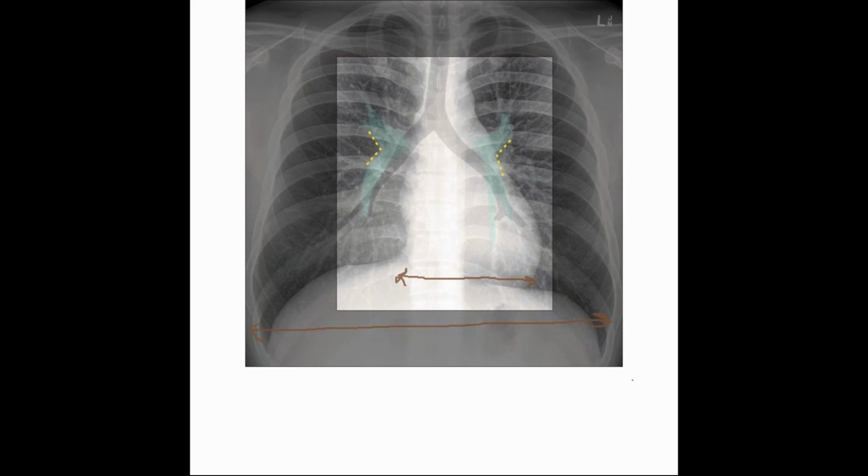Okay, so this is what we talk about. We are done with A, we are done with B, and we are done with C. Now we go to the D. What does D stand for? D stands for basically disability, or it's basically a way of thinking of any fracture, any bony fracture. That is what you're supposed to see.